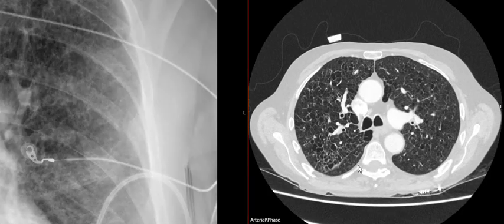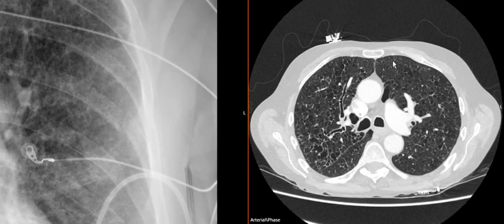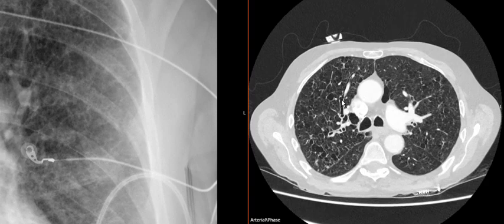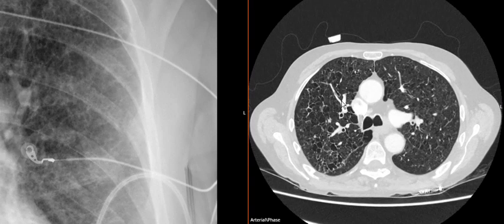So again, lots of just holes where there should be lung tissue. The lung should look like this, a bit of a fuzz of white pixels everywhere, not empty black space. So this airway does look a little bit thickened and dilated, running next to the blood vessel. A hallmark of bronchiectasis is an airway that's the same size or bigger than the blood vessel. Generally, the blood vessel should be bigger than the airway, with thickened walls.